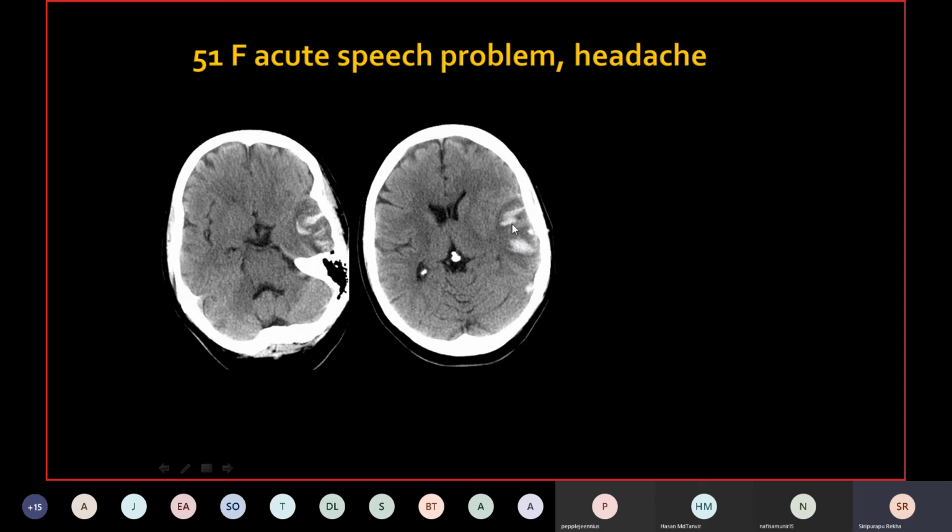You just have to take a moment back and look at this and ask yourself, what is happening here? Is this an infarct with hemorrhagic transformation, or is it such a heterogeneous area of ischemia? It looks like ischemia and hemorrhage. Could it be venous? And then the clue is actually on the CT itself, where you see this focal high density in the region of the sigmoid sinus. And that is enough for us to help in the next investigation.